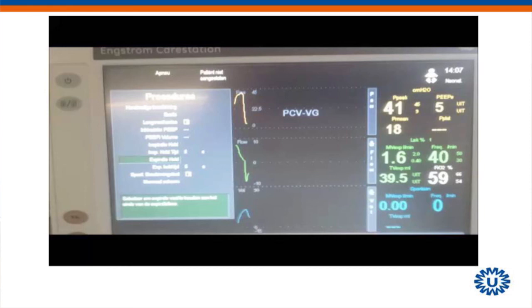Look here. Did you see the number change? Is there some auto-PEEP here? Yeah, here's auto-PEEP.